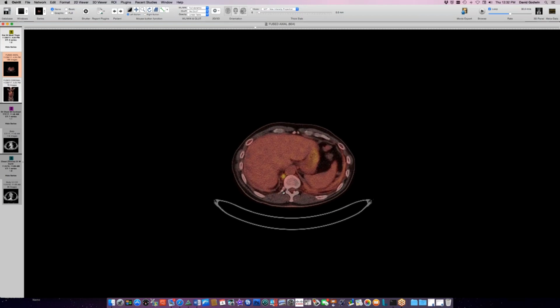By the way, this was not lymphoma, because that's another consideration, of course, for a diffuse disease in tissue. So it was not lymphoma, it was not Erdheim-Chester, and it was 20% positive for IgG4 staining among the plasma cells. So, polyclonal. And look at what it's doing to the aorta.